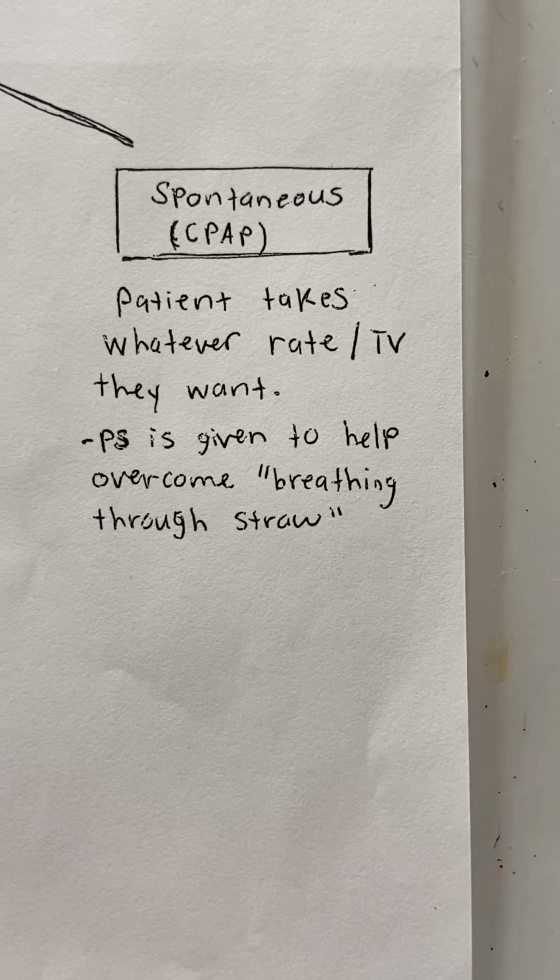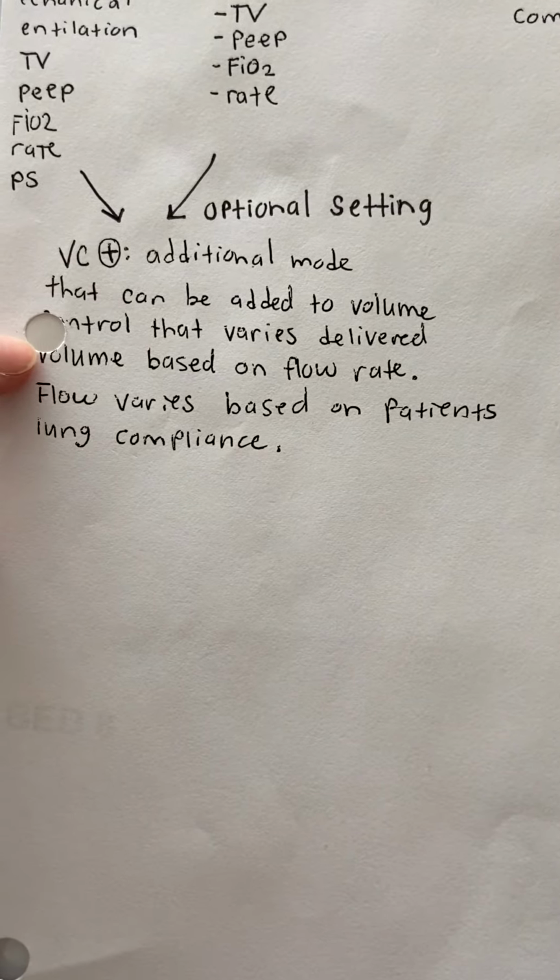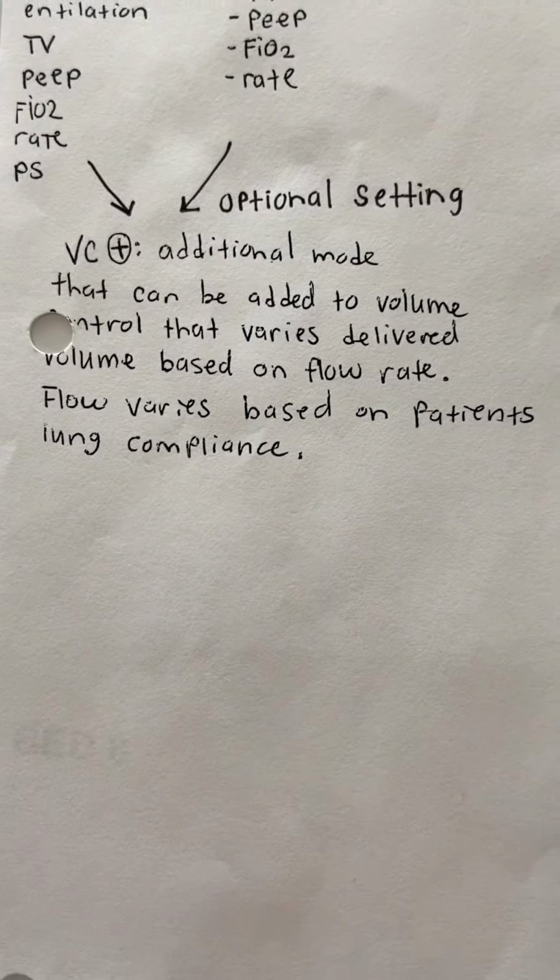I'm going to come back to VC Plus at the end of the video because I think it'll make more sense then. But those are really the three modes. So I'd like to step over to the ventilator and kind of go over what you're going to see.